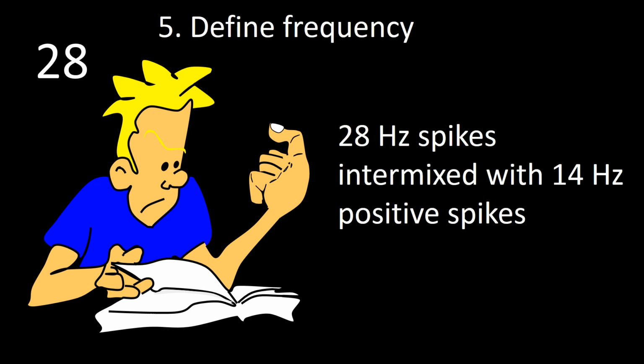Their frequency is obviously 28 Hz, thus being a harmonic to 14 Hz, which seems to be the fundamental rhythm in the 14 and 6 Hz positive burst.